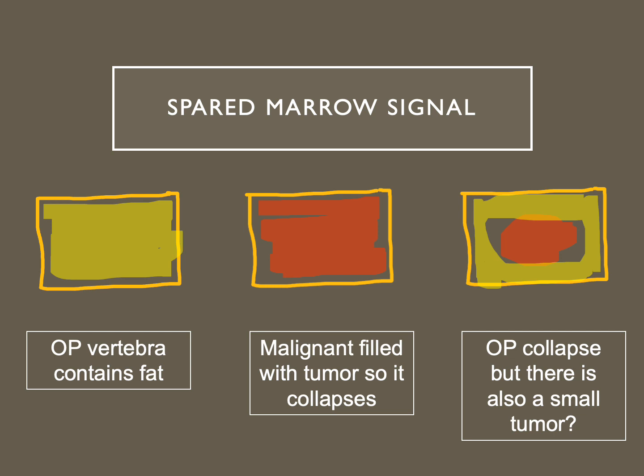There are the odd cases where you can have a small lesion and you have fatty marrow. So it's an osteoporotic vertebra with a met inside it. And here obviously it's very difficult to tell. If there's not much involvement of the vertebral body by the tumor, then the fracture could be more from osteoporotic reasons than from tumorigenic reasons. But let's not get into this. I think this is a slightly more complicated topic that we can discuss later.